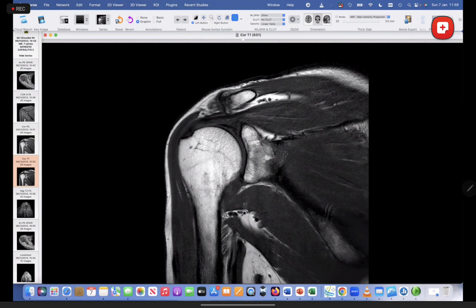And of course, you mention all of these things in the report. You don't always say positive things. Sometimes you add negative things as well. So, important negative: if there is no fat atrophy, I would say the muscle bulk is looking good and there's no obvious fat atrophy. It's an important negative, but you mention it in your report, because then the surgeons know that you've been looking at the muscles. Because what happens if somebody's got fat atrophy and a rotator cuff tear?